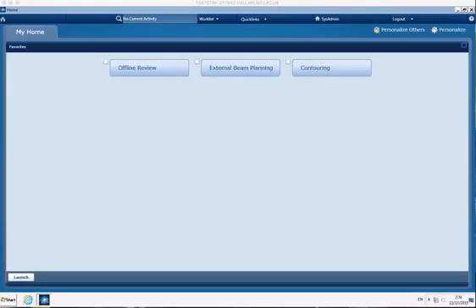Welcome to the first of a series of videos to work your way through for your assignment or the planning practical sessions that will lead to your assignment. So the first thing I'm going to show you is how to create your patient. What we've got is a template of a patient, and I'm going to get you all to copy your own so that you can have your own patient to do your planning on.